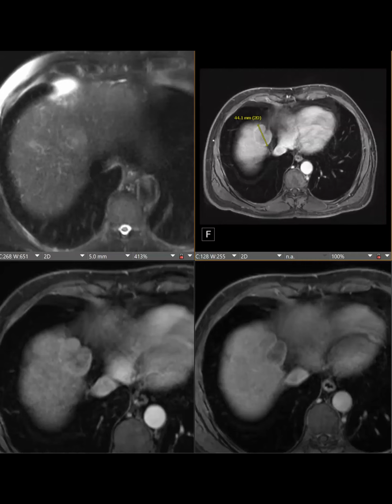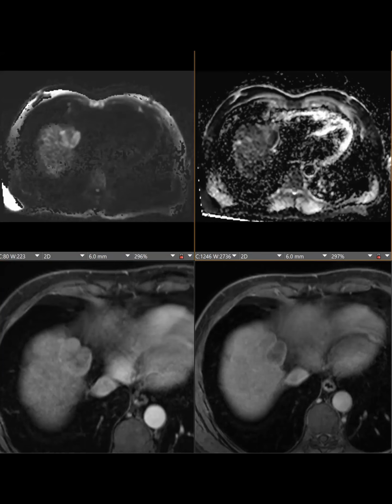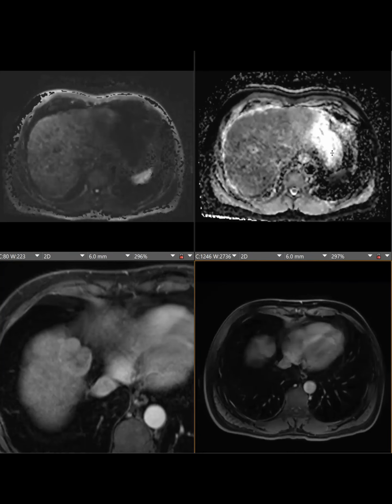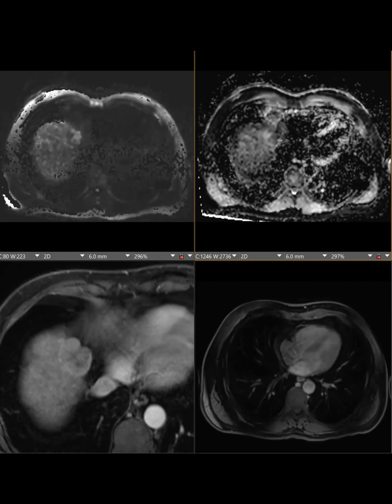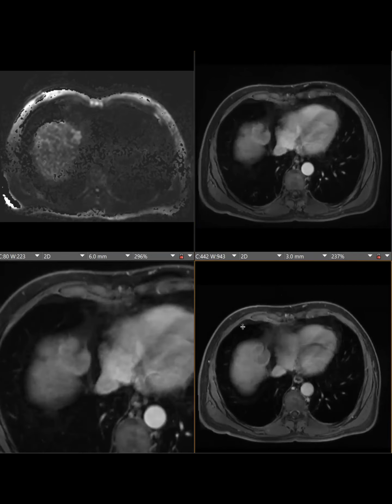I want to see, like, this was an outside MR and there's no diffusion, which is crazy. We do have a subsequent diffusion that we did. So here it is on a later MR, but this is after locoregional therapy, so it's a little altered. That's not helpful. Can I see the arterial phase, up and down? Yes. Let me give you the original pre-treatment arterial, it is this one right there. And then here's the 5 minute.